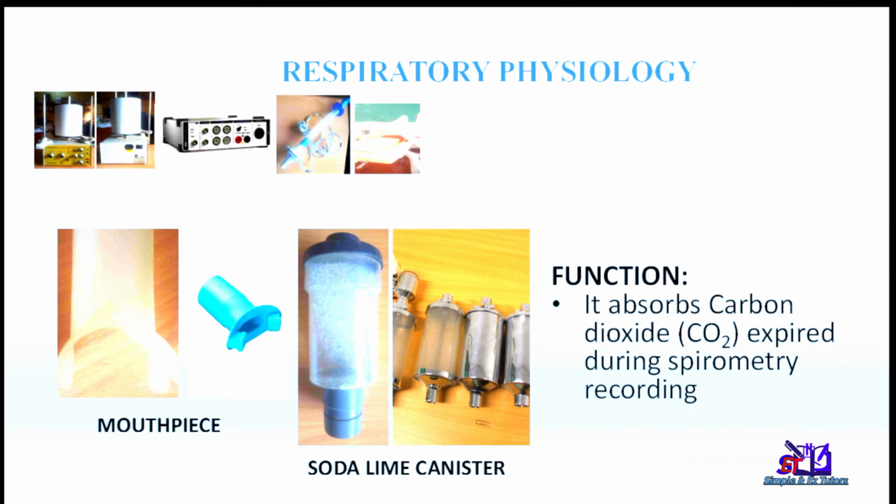So these are accessory instruments that are normally attached to the spirometer, especially the student spirometer or the traditional volume spirometer. This is the soda lime canister, which absorbs carbon dioxide expired during respiratory recordings, to prevent suffocating the subject with carbon dioxide. The mouthpiece connects the subject to the respiratory circuits of the machine. We have disposable mouthpiece and reusable mouthpiece. These ones are the reusable mouthpiece. This one is for Powerlab, while this one is for the student spirometer.